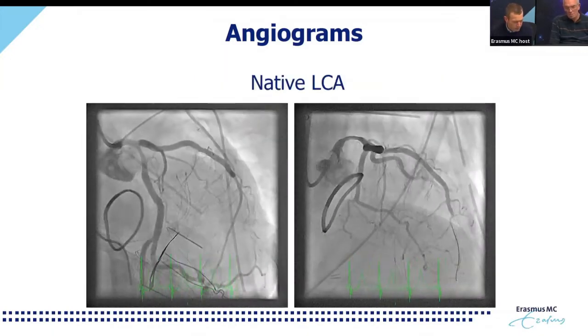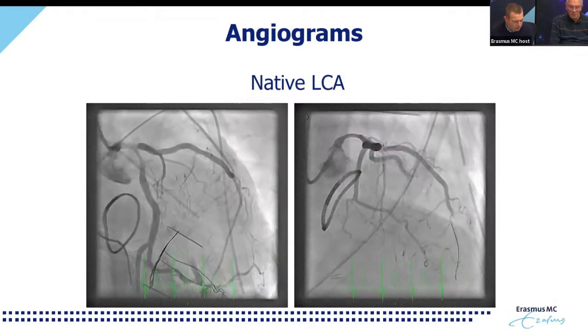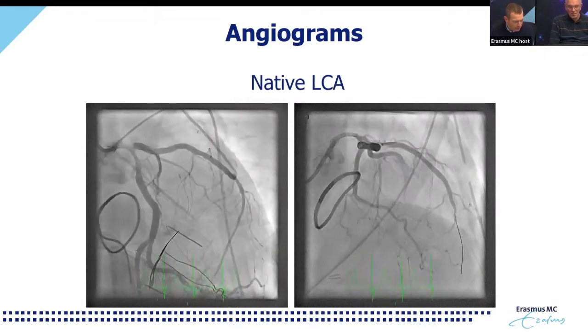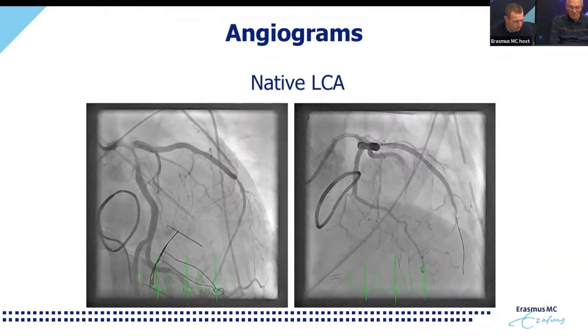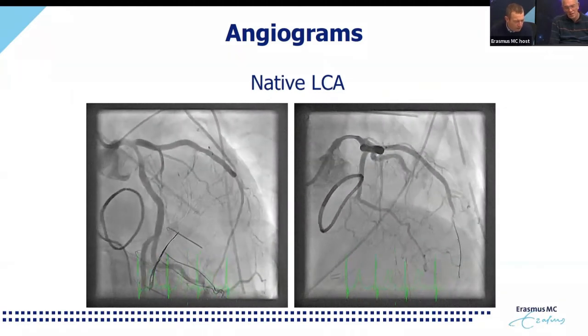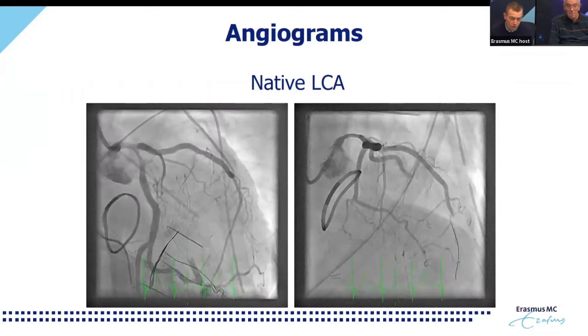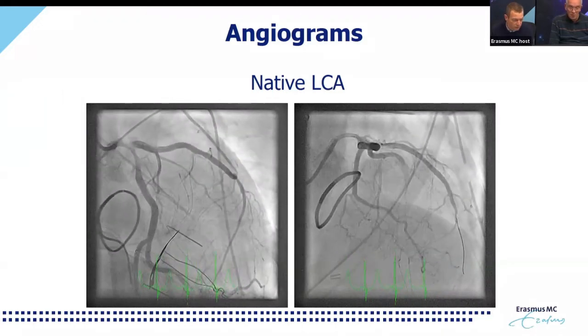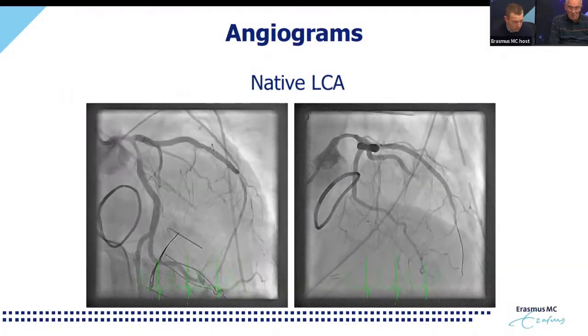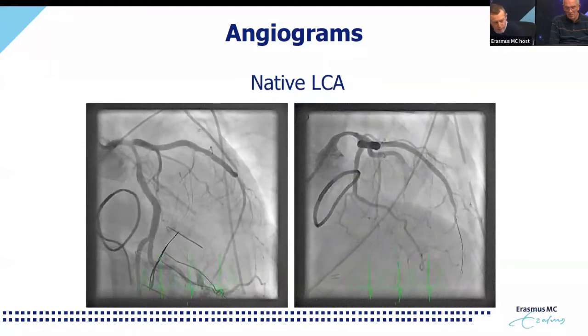And then the key reason for doing this angio was obviously this ostial, mid-distal left main disease with the hazy aspect. We knew there would have been trauma from the outside, but we obviously didn't know how this vessel would look from the inside and would therefore justify any further treatment, despite the fact obviously that this patient already had bypasses.